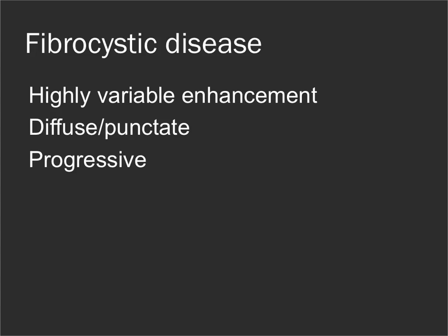And one of the things we're always looking for when patients have a lot of fibrocystic disease is the black sheep in the family. So we're looking to see, is there any one area that really looks different in terms of its morphology or its washout kinetics compared to any other area? And if the patient's got a lot of different little foci of enhancement scattered through one or both breasts, and they all look very similar, we're probably going to blow that off.